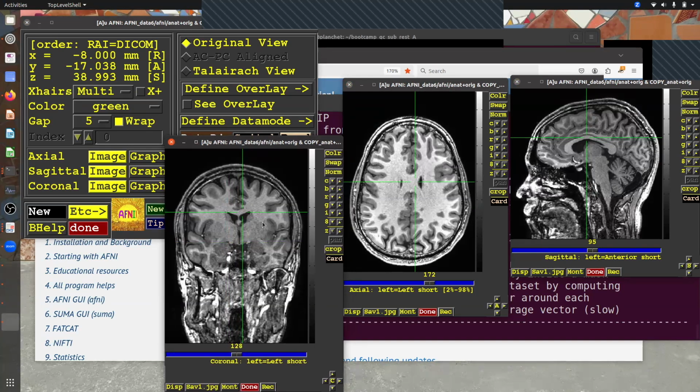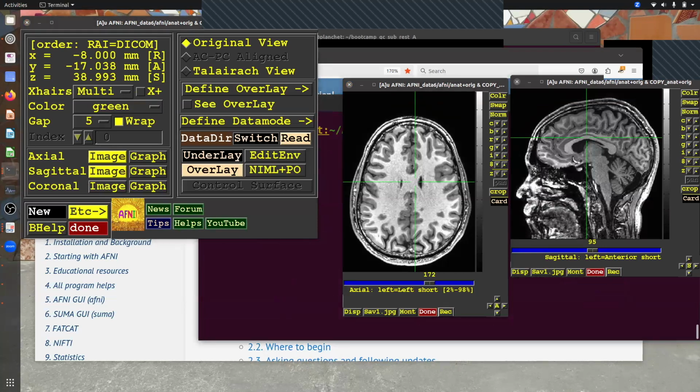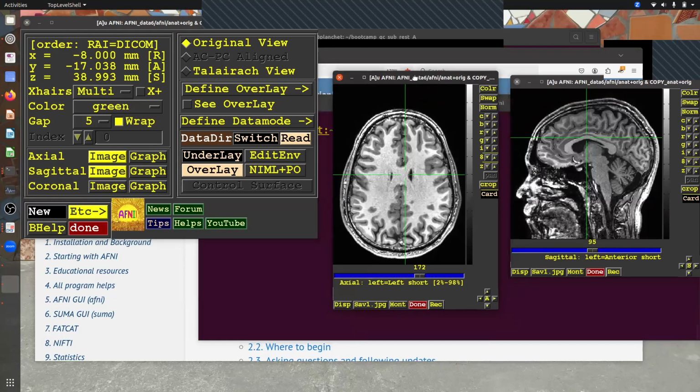And when we're looking at this, we talk about 3 dimensions, we'll look at it in this kind of rendering as 3 different planes: the axial plane, the sagittal plane, and the coronal plane. And actually, I'm just going to turn one of these planes off just so I save a little screen space. And there's text in the terminal. We don't need that at the moment.